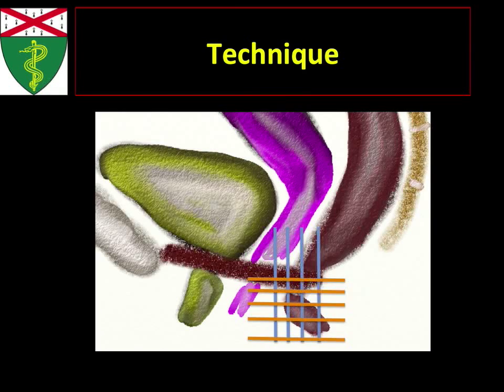The problem with that is that you could be missing some of the fistulous tracts themselves. You really want to go axial and coronal with respect to the plane of the anus, which in fact is in this plane over here. So we want to make sure technologists don't do that. They're very good at not doing that, but when we have to monitor these studies, we want to make sure that they do it properly. So we don't like that.